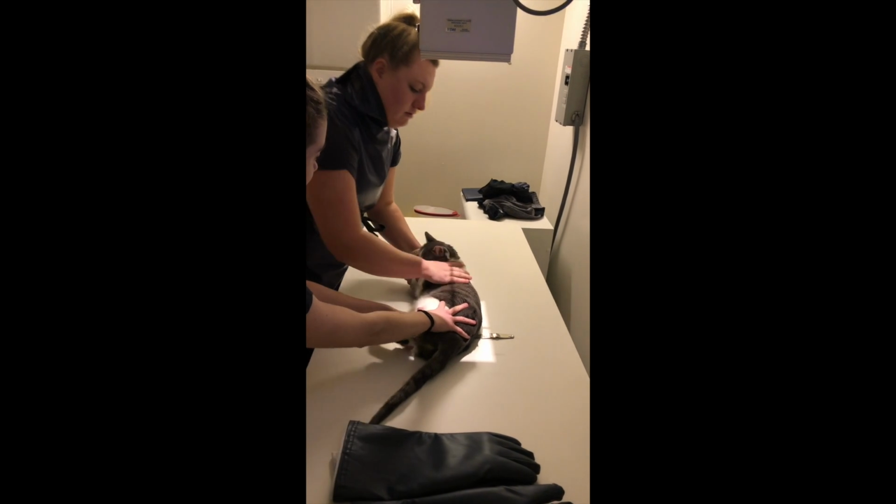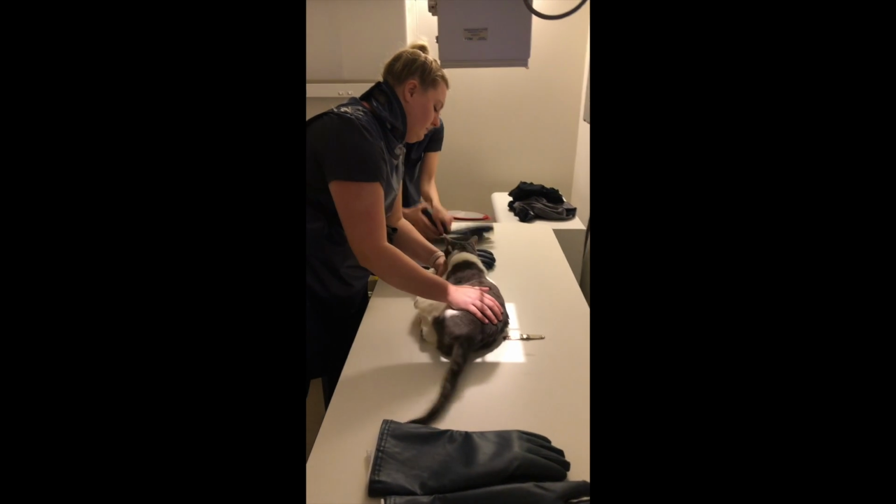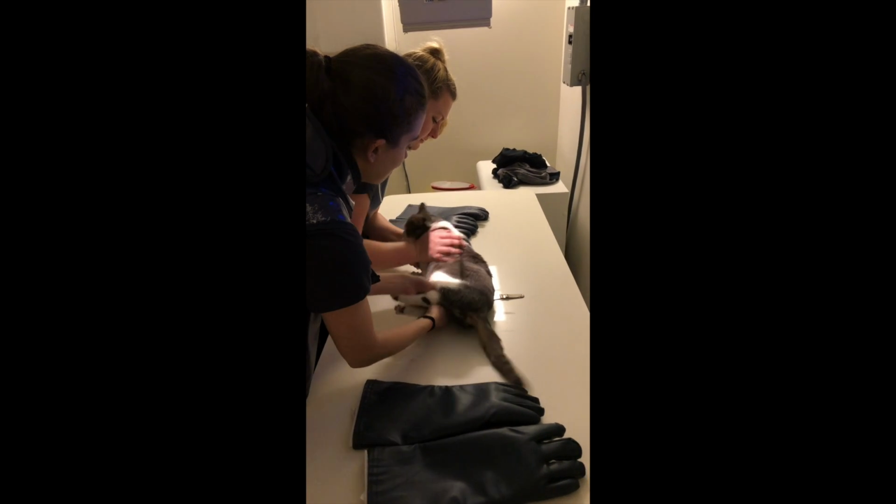post, the stomach is mostly empty and complete small intestine is highlighted, 4 hours post, the small intestine and large intestine are highlighted, and 5 hours post, the stomach and small intestines are empty.